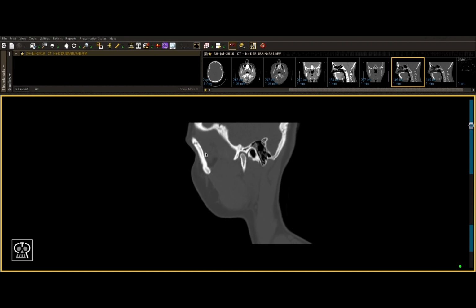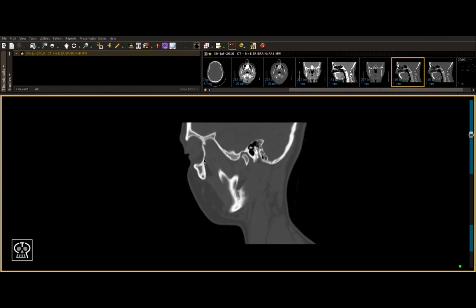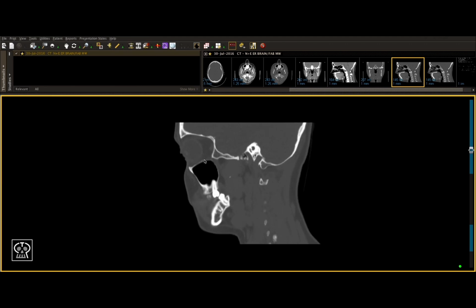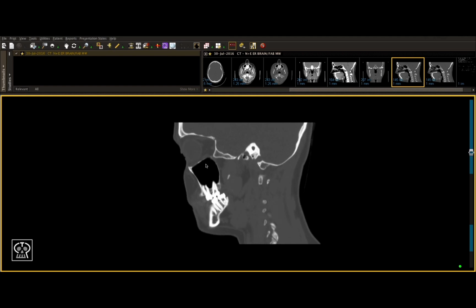Internal to the orbit, we have our ZS suture, which is difficult to see in this view. Finally, we have our orbital floor, which is very easy to see here. And remember, displaced zygomatic fractures will almost always have an orbital floor component that can be visualized, as the zygoma forms the lateral and inferior borders of the orbital wall.